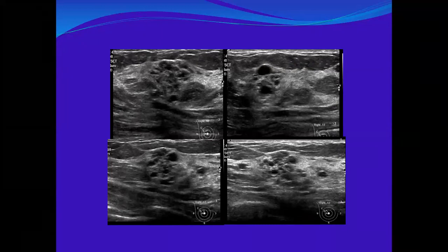For me, the ultrasound showed multiple cystic areas of different sizes, corresponding with different focal angles. Fibrocystic. This is the same but different angles, you see. Areas of focal fibrocystic change, clusters of variable size cysts causing a mass-like appearance, but no associated suspicious features.